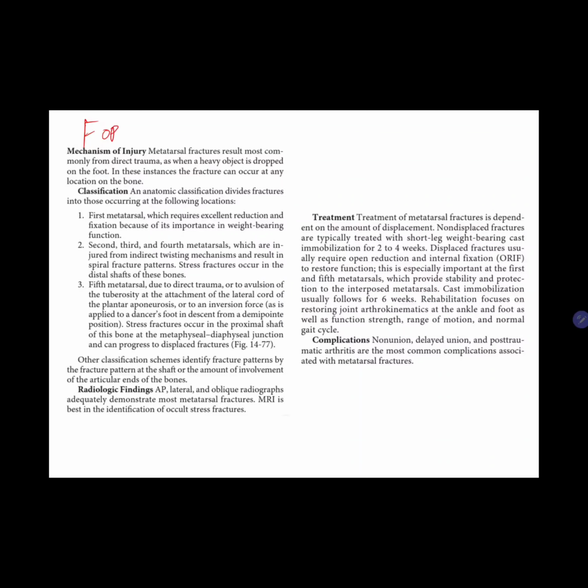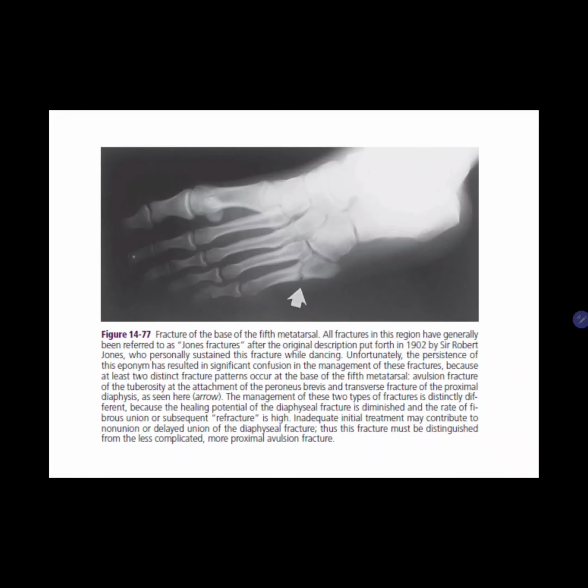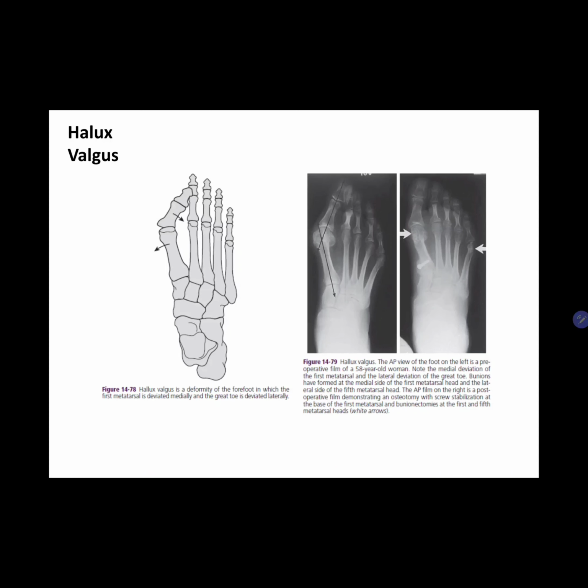And then so we go with deformities of the foot. Oh, this is a fracture of the base of the fifth metatarsal, so I think you can really appreciate it there. Okay, so for deformities of the foot, there are abnormal foot positions, maybe congenital or developmental, or may result from traumatic conditions or neuromuscular impairment. The entire foot may exhibit structural or anatomic deformities, or the deformity may be confined to a segment of the foot, such as the forefoot, midfoot, or the hindfoot.